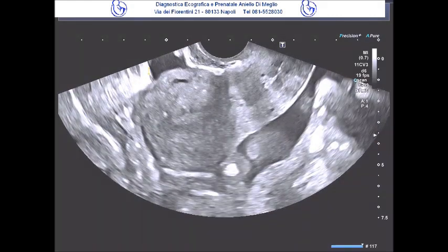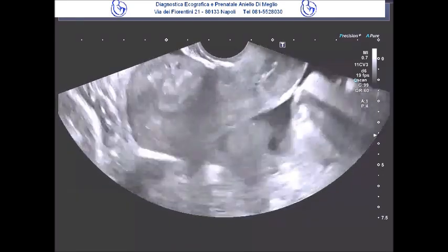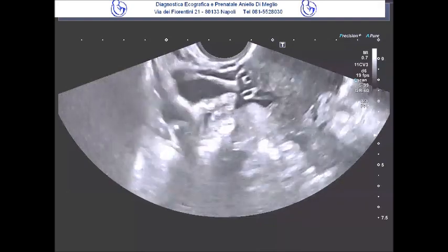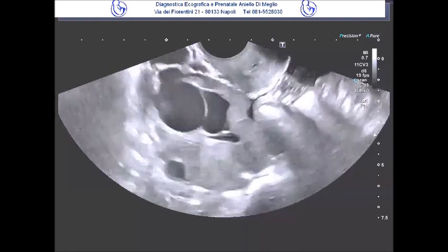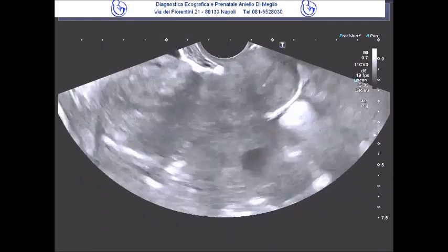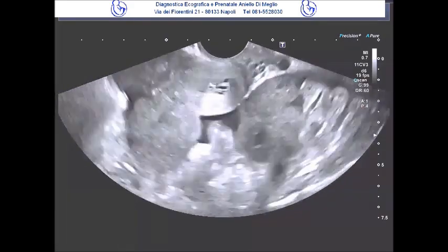An extensive assessment in the same general area of the upper abdomen, so a comprehensive evaluation of the liver, the spleen, and other vital structures that can be thoroughly explored by ultrasound imaging turned out to be completely negative. And obviously, this is certainly an extremely important and crucial factor to also take into careful consideration. The characteristic of bilaterality, of course, is highly suggestive of a malignant neoplasm as opposed to more benign borderline forms.